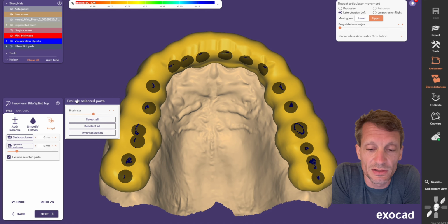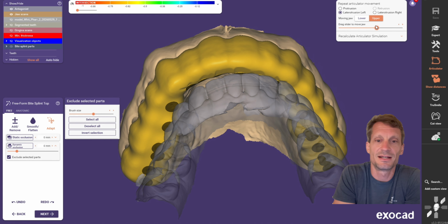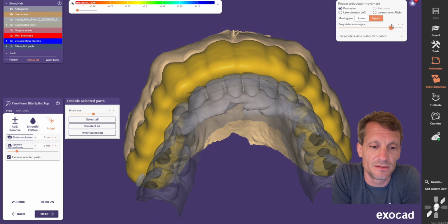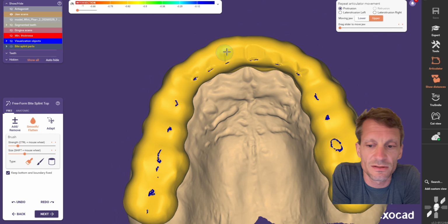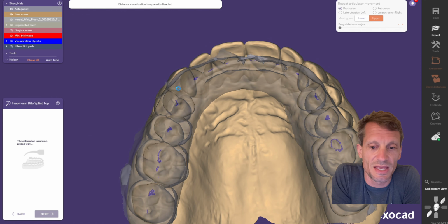So there you go. Look at that. It's ground in, lateral movements, also protrusive, and you can just come back in and just kind of smooth those out a little bit so it's not rough and something that's going to irritate someone's tongue or grab their attention. But I'm really excited about this splint here. And there we go. That's that.